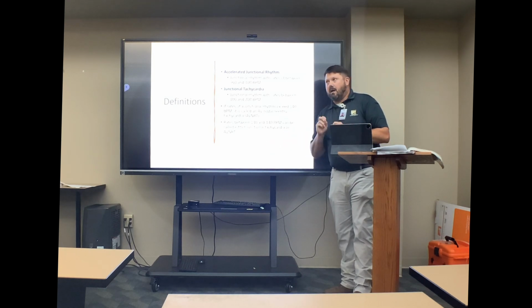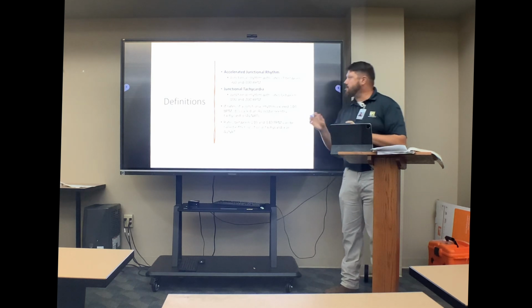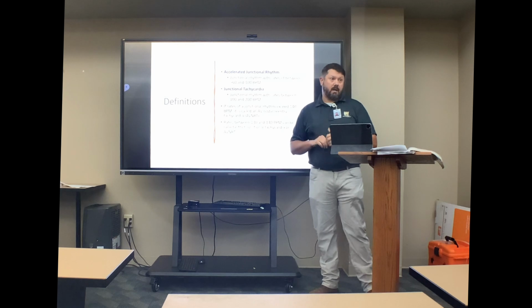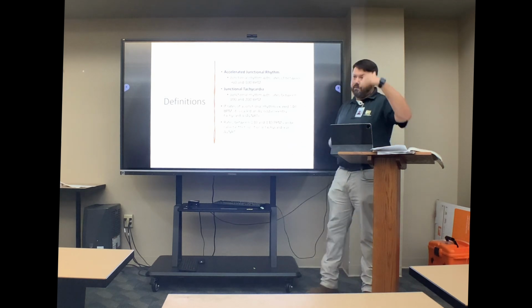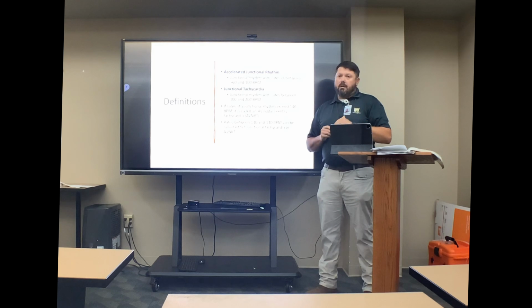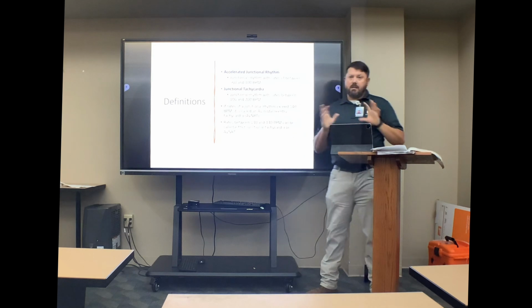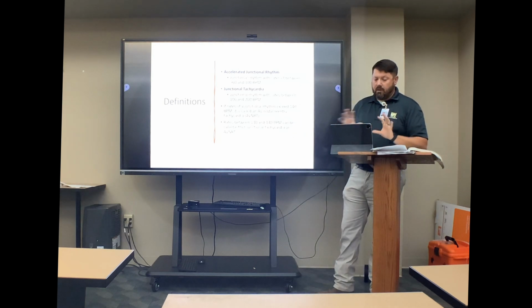As a matter of fact, if you want to get technical about it, a junctional tachycardia would be considered an SVT because it is a supraventricular tachycardia. The treatment would probably be the same as well. We're going to learn how to differentiate them, but it's really not a big deal between those two.